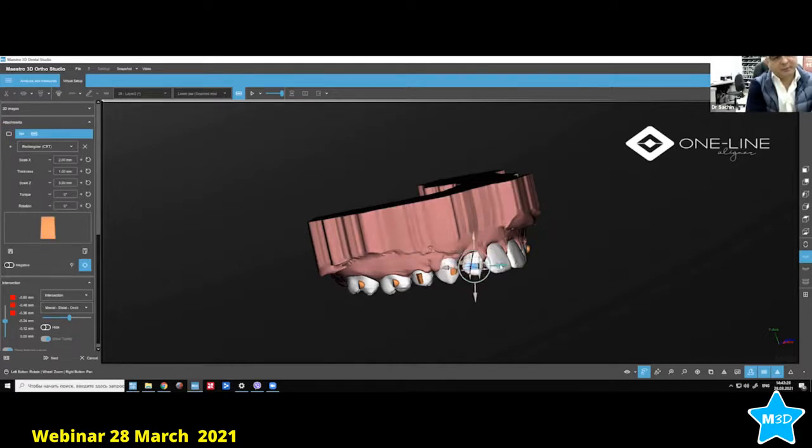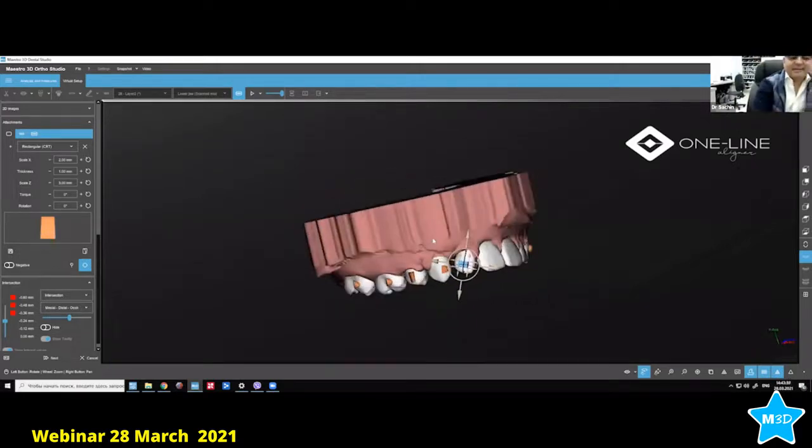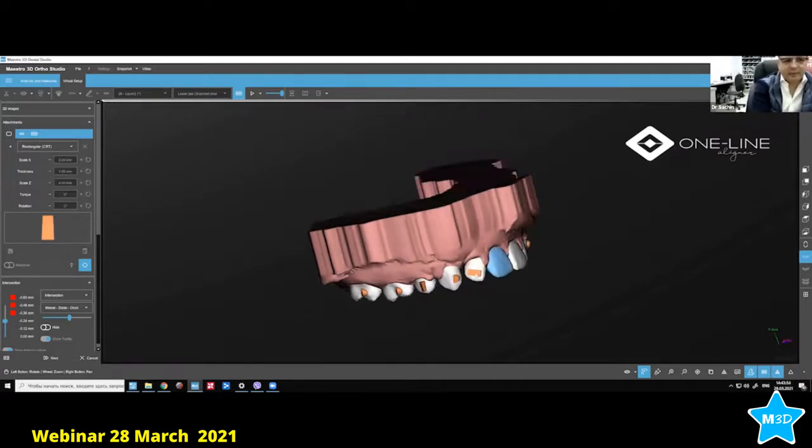You need to place it according to the axis of the tooth. This is actually a horizontal attachment, similar to Jonathan Nicholas's sash attachment which he came up with. The only difference is that you can make it a little bigger. And you have to be as down as possible.